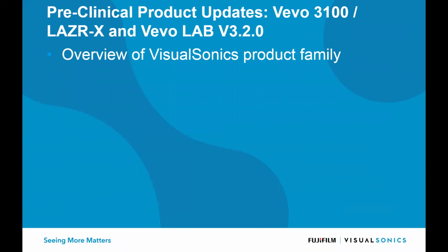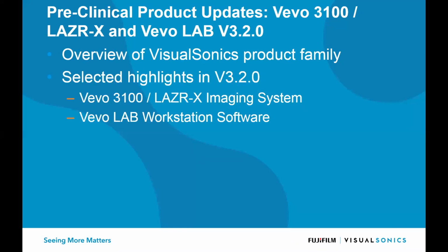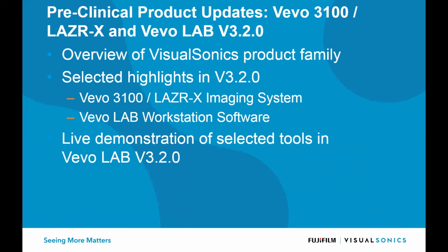We'll just give an overview of the VisualSonics product family, and then we'll start into some of the highlights of our latest software release, again on the Vevo 3100 and LAZR-X imaging system, and also on the Vevo LAB Workstation software. Because some of the really neat new features are available on the Vevo LAB Workstation, we'll flip back and forth a little bit between the presentation and Vevo LAB itself to do a live demonstration of some of these tools. And then, of course, we'll have a Q&A session at the end.